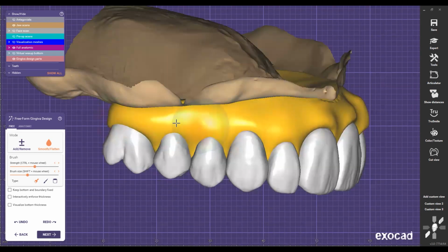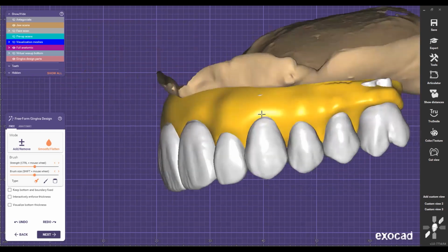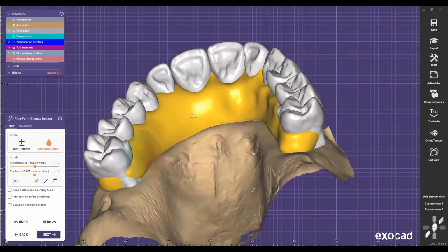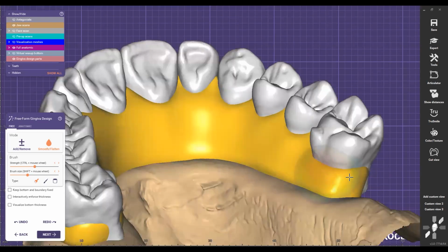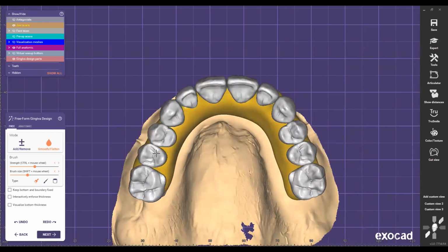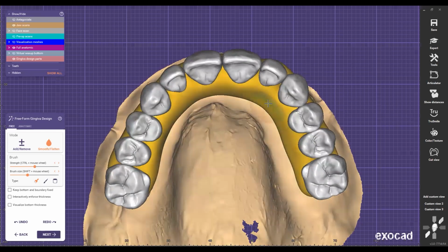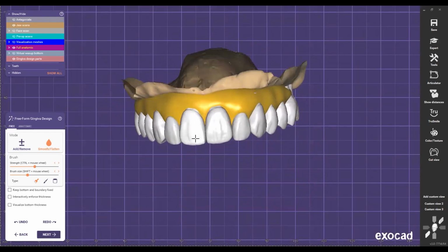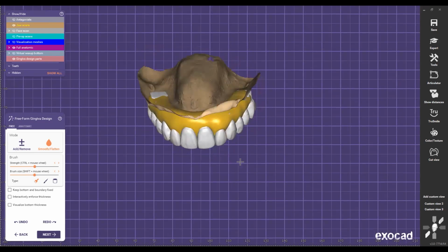And then I go right away and start getting the torch. I go here all around and then start going here. Because if I start smoothing right away, then the material is not going to be spread properly, and I'm going to have to go back and start filling areas. Now from here, I like to make sure that everything looks even, a nice horseshoe shape, because I don't want thin areas and thick areas. Same thing here. Once I have a nice area here, and remember, this is going to be up to the bone reduction, so you're going to make my life easier once I'm done.